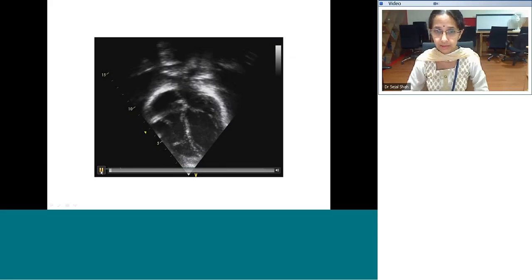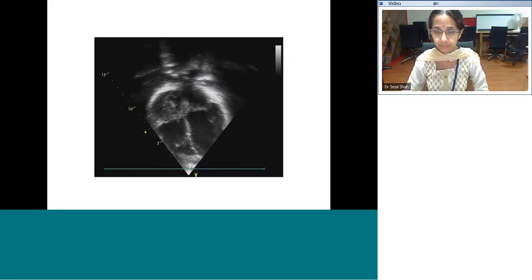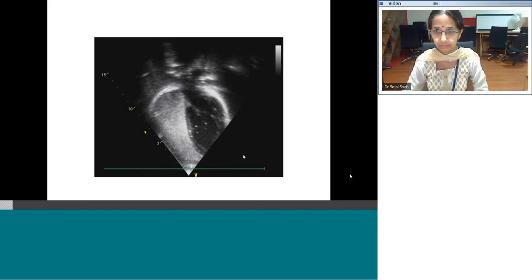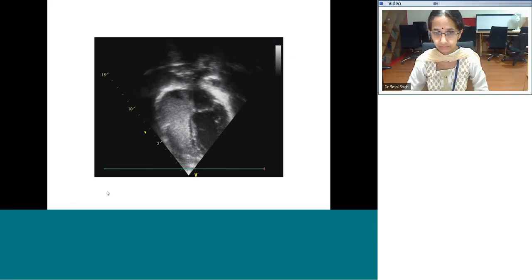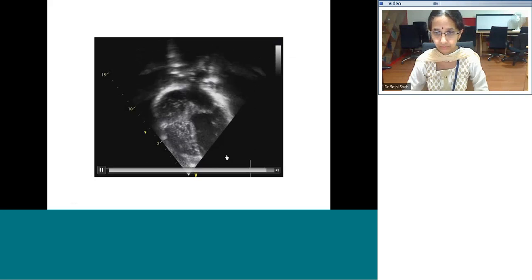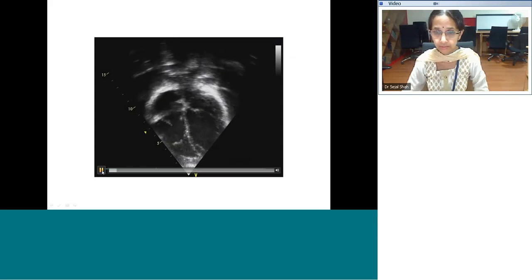So all of you can see this video. It's a 4-chamber video. I'm going to play the video once again.